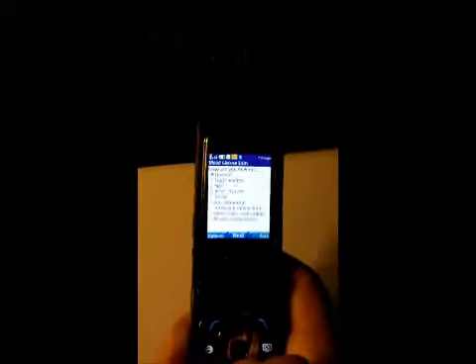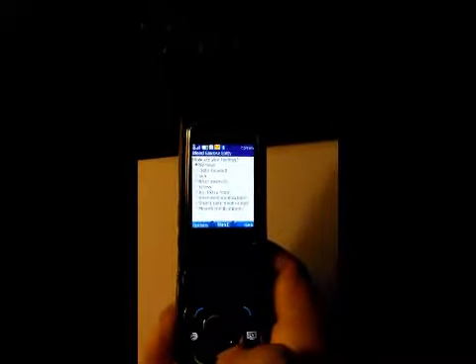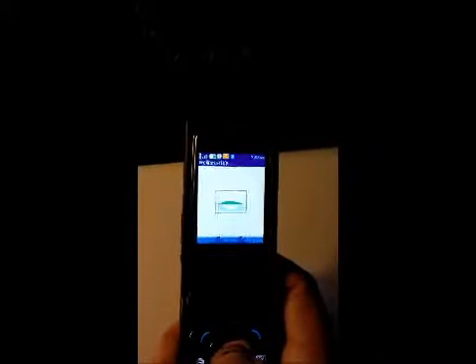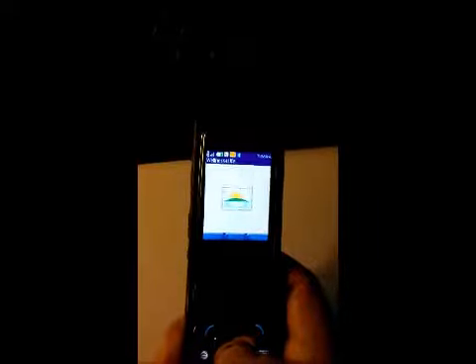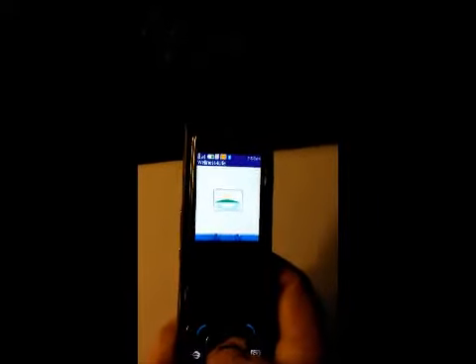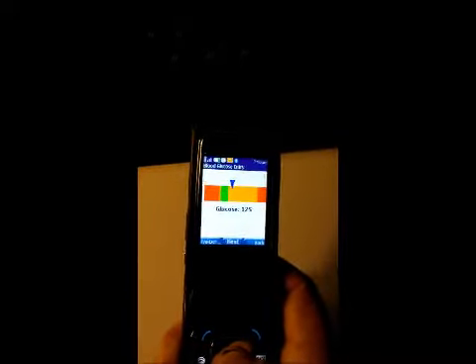Then I'll say how I'm feeling, because that's important. If we're not feeling very well and the blood glucose is high, that actually triggers an alert, but I'm feeling just fine right now. And then we've collected the necessary information so that gets submitted right into the record. And as it's been shown before, it'll go directly into the record, but it'll also provide a graph right here that will show you where you are.